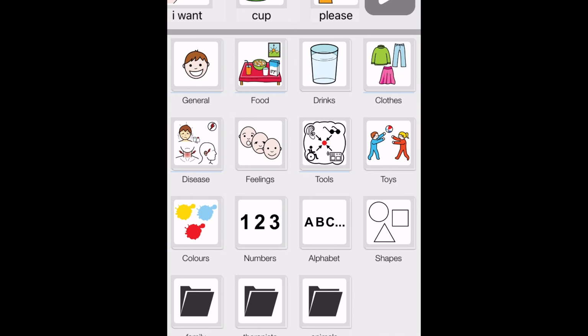I really believe in educating parents, and as much as the parents can have control over situations, the better. I'm not a speech therapist, and so I am sure that there are limitations with this app that there maybe are not with some of the other devices like a Dynavox or different things that cost thousands and thousands of dollars. But what I love about this is you can get something similar for free, and it can be across multiple devices, and you can have family members have similar opportunities to speak and reinforce vocabulary and academic learning with their kiddo. And that to me is such a game changer.